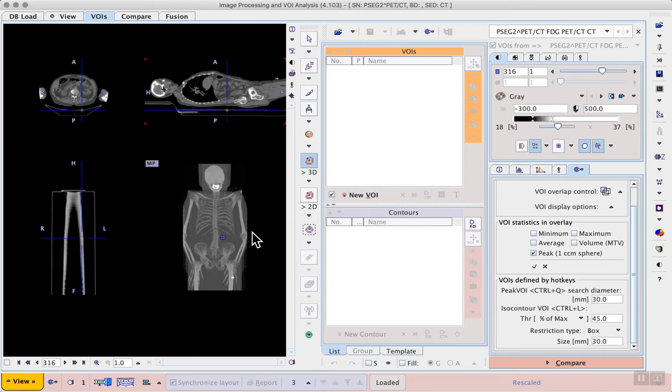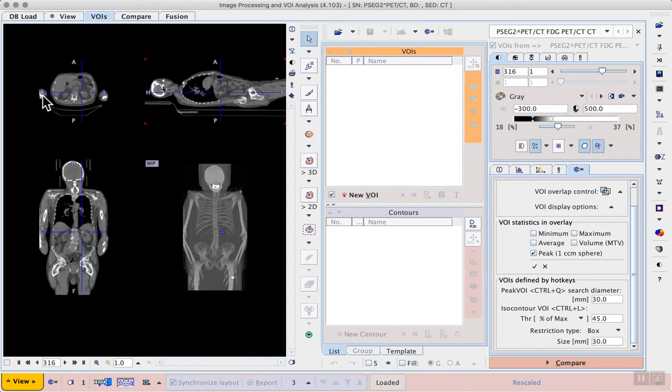If we triangulate a location there, make sure that the VOI mode is neutral, then we can see that the arms are the widest point of the image, along with this separation underneath the body that we saw on the last page. So we need to draw a custom VOI using that gap to our advantage, but making sure that we include the arms properly.